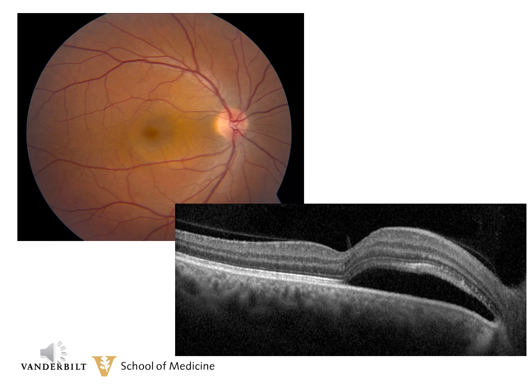You can see in the right eye that there is some abnormal look to the foveal area extending from the nerve to just temporal to the fovea, and it goes from almost the superior arcade to the inferior macular vessel. The OCT demonstrates quite well the nature of the subneurosensory fluid.